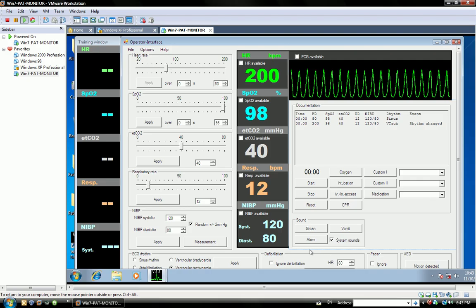It will make its last medium priority sounds, the last bit, and the first and second bit of the higher priority alarms, the most critical. The medium and the low are mid and low critical.